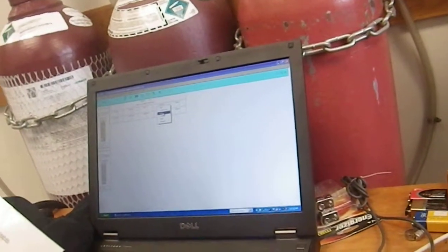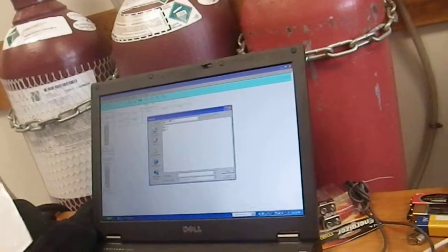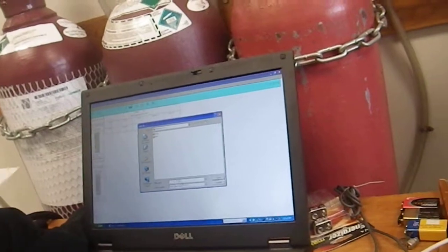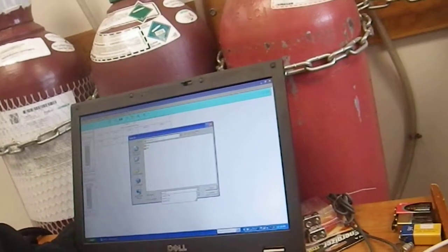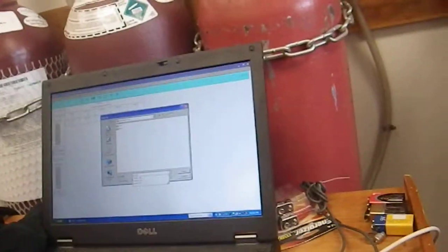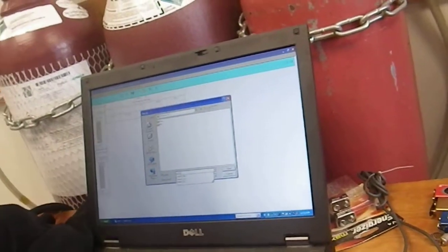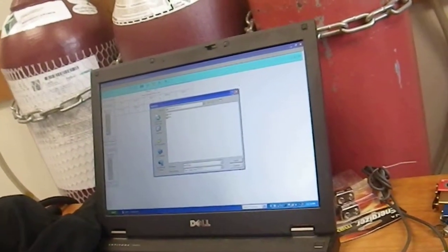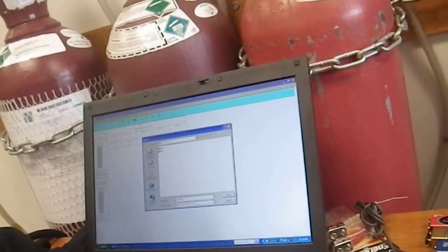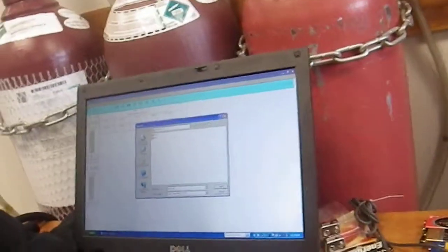Right click, log. It'll ask you where you want to write it to. So here you put your file name in. In this case, I just paste the name I had before. You can either just leave it, or we usually do .pb for playback. You don't have to, you could go like export or whatever you wanted. That's what we do. So you go save.